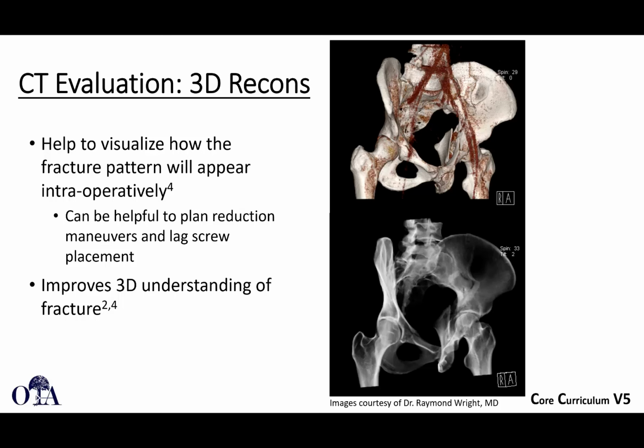3D recon. We have been looking in some of the previous videos at iliac and obturator oblique views that I believe were not actually radiographs, but CT scans, 3D recons, which are then reformatted to make them look like an X-ray, right? And that's on the bottom, I believe, a 3D recon. And on the top, it's probably the same 3D recon, but shown as a bone model, which a lot of the software will render for you. This is really helpful. This can really help show your fracture pattern, how it would look intraoperatively.